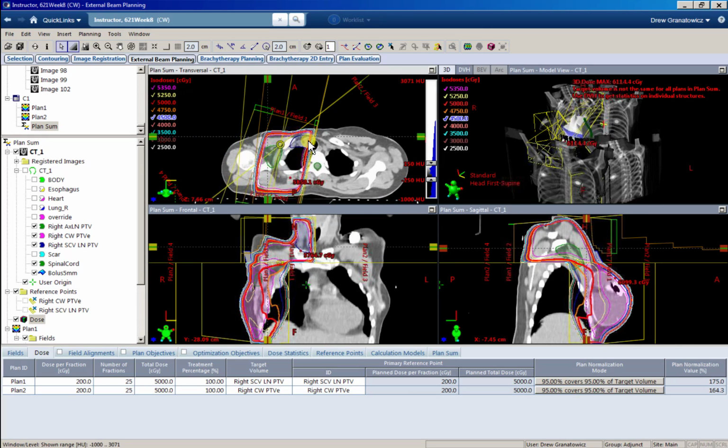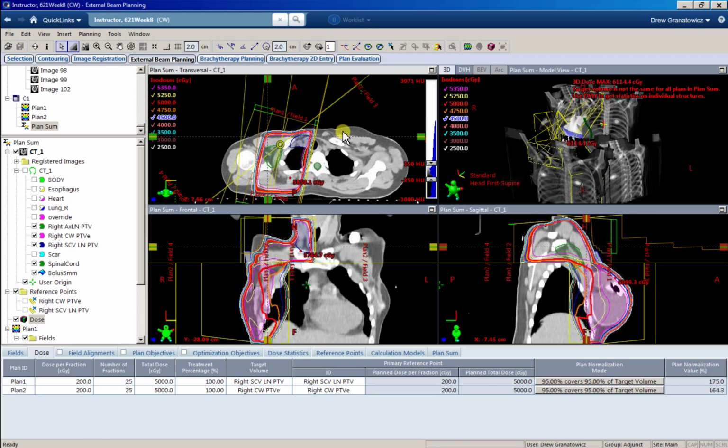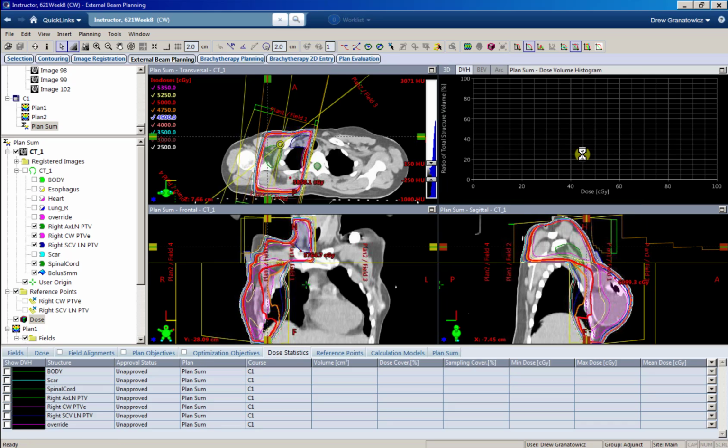All right. Always good to save every so often when you're planning these, especially these longer plans. Next important concept to figure out is this one.